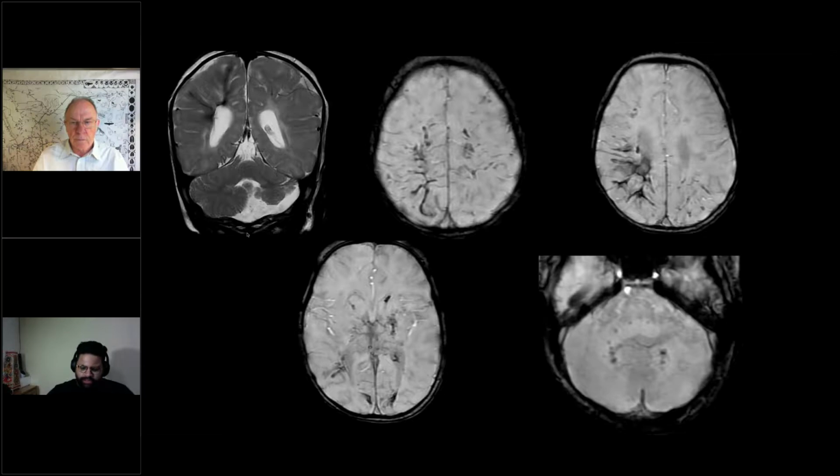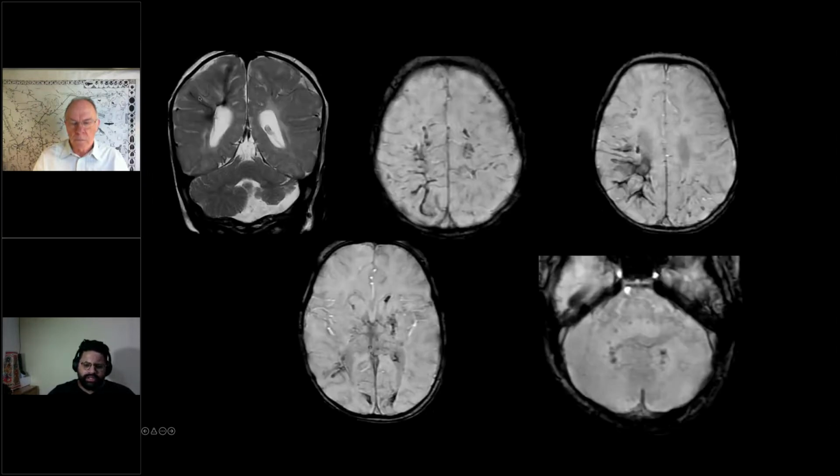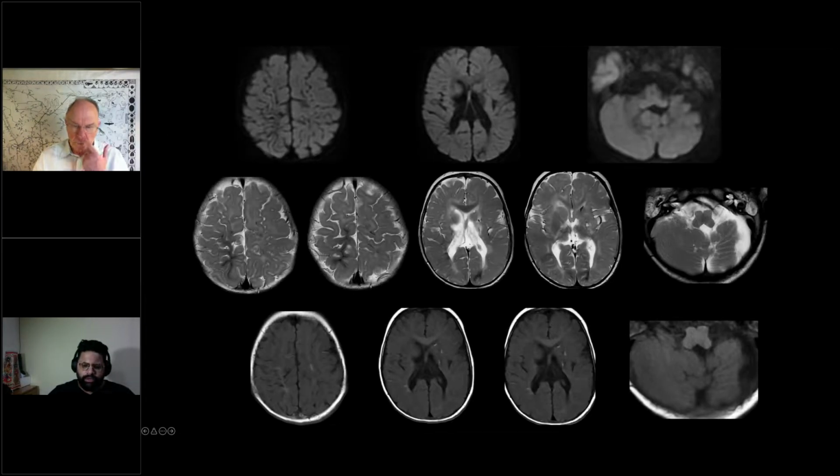So yeah, that is the hypothesis which I could come to. If there are any other suggestions? Even the corpus callosum posterior part is also looking dysplastic. It is thinned out. That is along with the process of overall gliosis or chronic ischemic changes, because the white matter itself is completely abnormal.